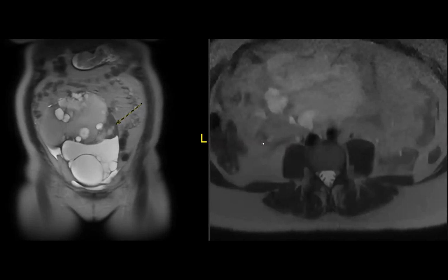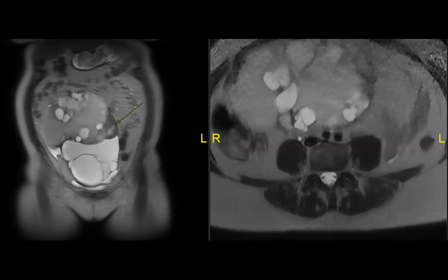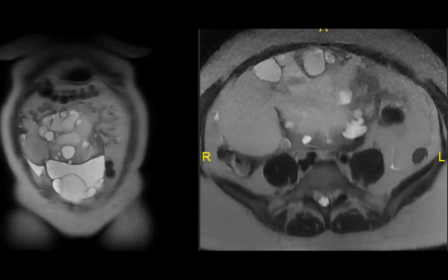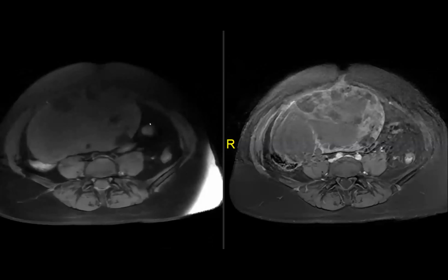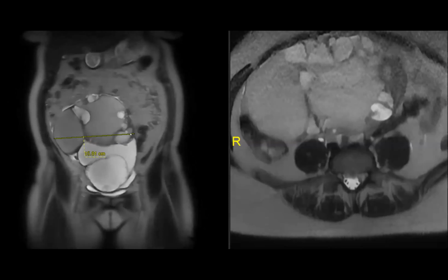But when I went back, I mean, is this it? I don't know. I don't think we can see it at all. I tried to find it and see if we can see it, but I don't know if there's an association between the mucinous tumors. Is that T2 dark part, the one you're pointing at on the left screen, what you're thinking is the Brenner part? That's what we thought, there was a solid enhancing component. There was no subtraction here, so that was a little concerning. The original report was saved by the fellow, who thought this was part of the normal ovary, but I didn't think so. I thought this was the solid component.